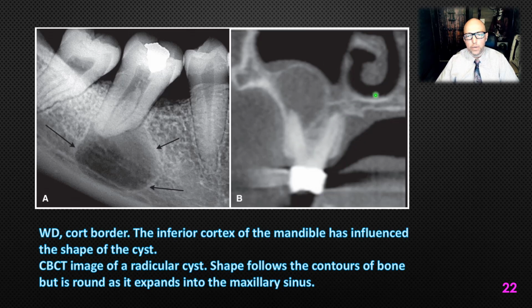This one, if you're not looking at 3D images, might be hard to tell. You can probably recognize that that's a tooth there. But what we're looking at is a coronal slice. A coronal slice is in this direction, so it's as if you're looking right at the patient. So if I'm looking at the patient, I'm just seeing one slice that's less than a millimeter thick. This to me looks like about a 0.3 millimeter thick slice. And so you're just seeing one section of the tooth.